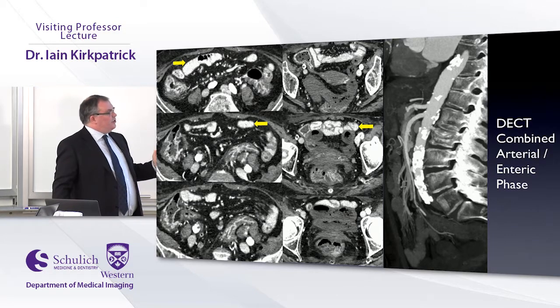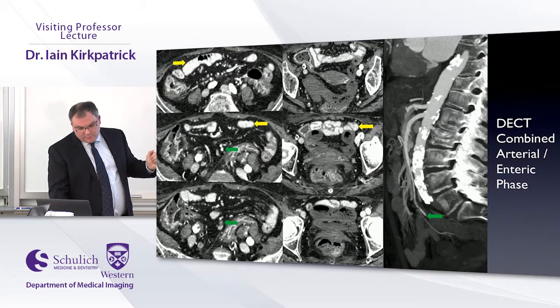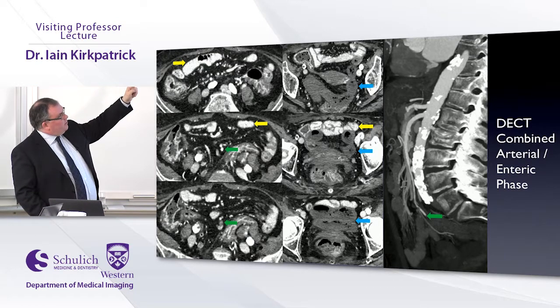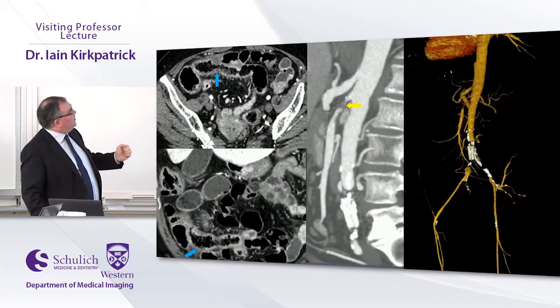So this particular patient, they had an abrupt occlusion of a branch of their SMA, and you can see that right there. There you can see that branch vessel open, and there's the embolus within it right there. And I just want to point out how conspicuous the hypoenhancing bowel looks now compared to the normal bowel. So we've really brought out that difference. One more to try and convince you.